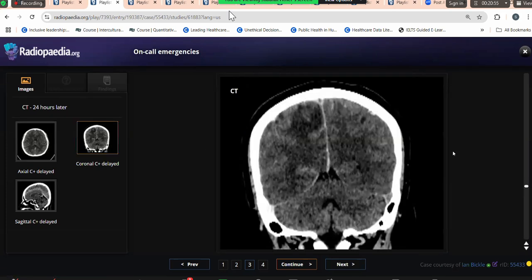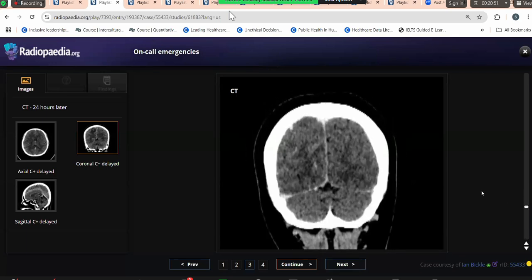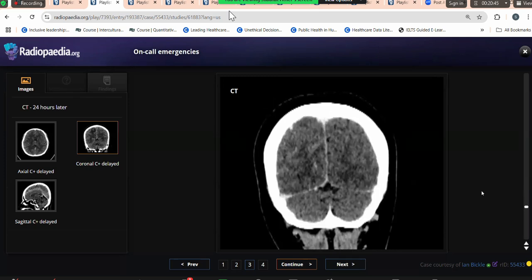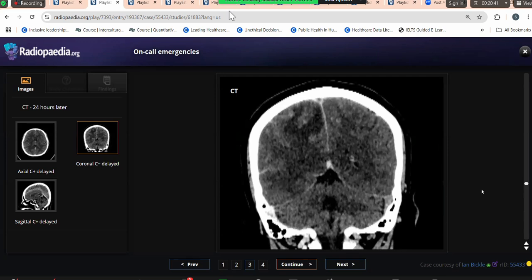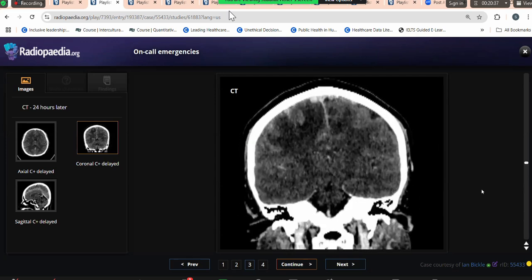When the examiner thinks that he or she needs to give you additional sequences to make the diagnosis, he or she will. But if the examiner thinks that it can be done on axial images, they will provide you only with the axial images. So now I have given you coronal because I think it would help you. Can you give me any additional finding and then we can conclude the Viva?